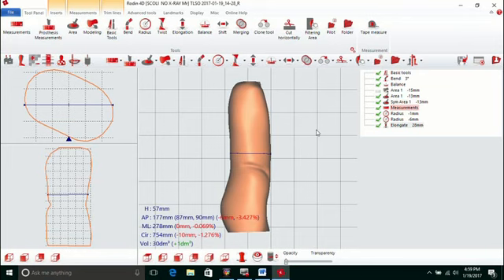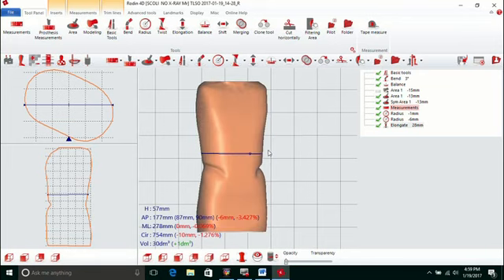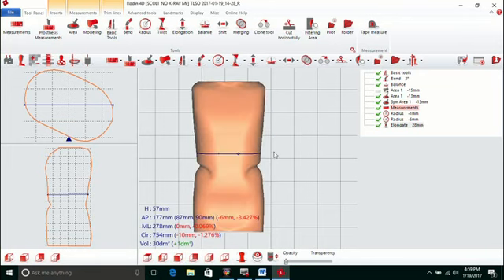Alright, let's see what else kind of cool tools we get. I think for basic introduction, that'll pretty much get you started. I would say get a practice model, start playing with the tools.